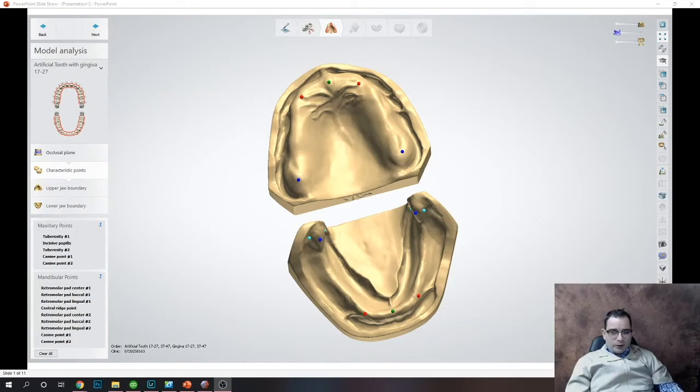So I've been working with a program called 3Shape and trying to fabricate digital dentures. You can also do the same thing with ExoCAD and some other programs. But I work with VITA on utilizing their Vigo tooth concept, which is kind of an interesting thing. They've redesigned their tooth molds to be specifically used for digital dentures. So there's no undercuts on the basal surface, and they have a slightly lower profile, which makes it easier to work in situations where you have not a lot of room.